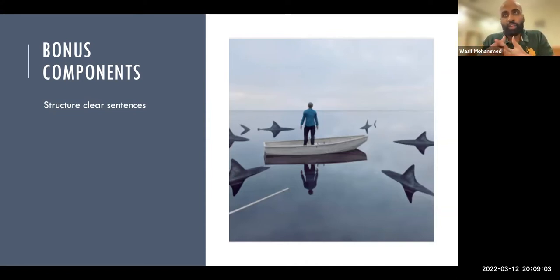I think preparation for the long cases actually gives you the background, the structure sentences that you use in your answers in long cases. You can use the same sentences. Solitary, well-defined lytic lesion, okay, is seen here and here. You don't mention the size, you don't mention this. So exactly the same thing.